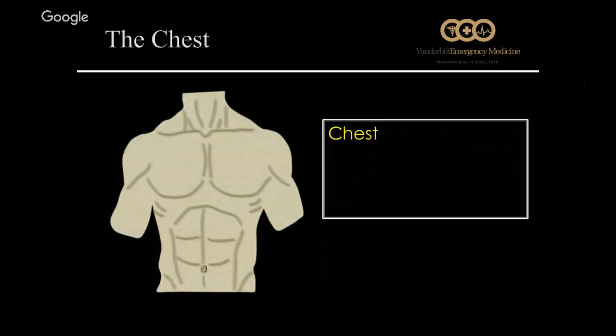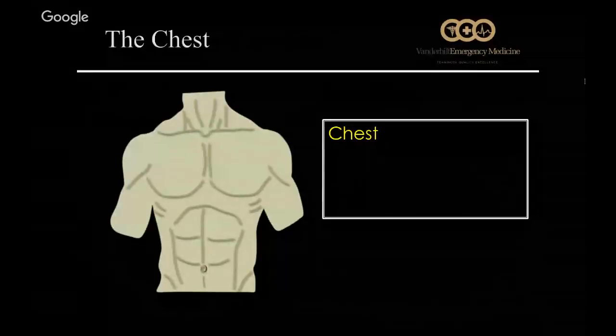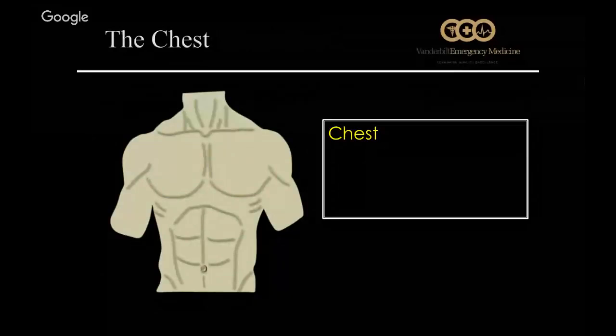All right, so just to recap, when we're looking in the abdomen, there's three main places that fluid will collect. The right upper quadrant, we looked in Morrison's pouch, and then the tip of the liver. Left upper quadrant, we looked on the dome of the spleen and at the tip of the spleen, and then down in the pelvis in the pouch of Douglas in females, and then in that rectovesicular space in males.